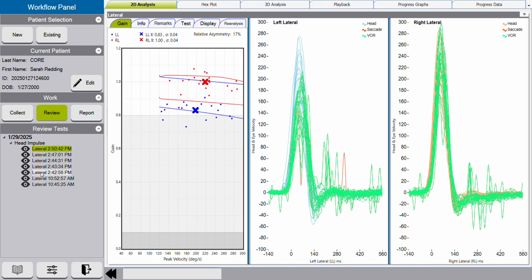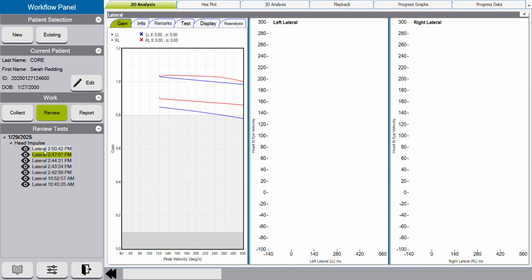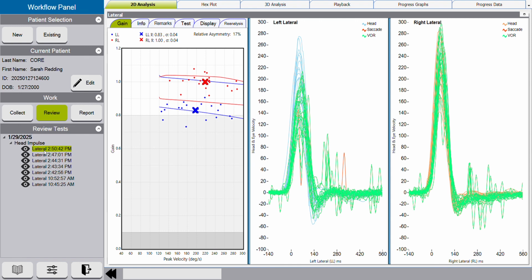and it's got all the ones that we were practicing with here, so you can click on the different ones if you've run it multiple times. But this top one here is the last one that we just ran, and so over here we can see all of the data. And so this is the first screen where you're going to start your analysis of your V-hit responses.